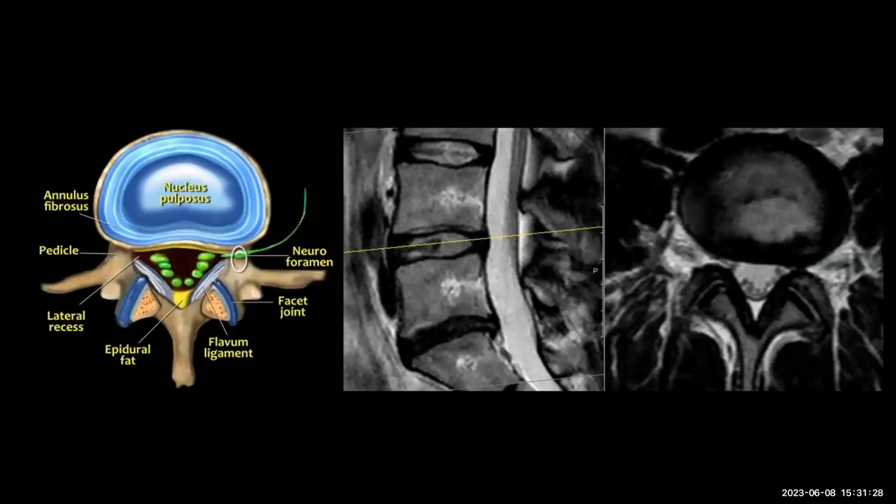So that's all about disc herniations and how they result in stenosis and nerve compressions. And as you've realized from the talk, it is not just quantifying the degree of stenosis of the spinal canal, the lateral recess and foramina, but you have to make statements about what impact they're having on the nerves themselves. What are the other causes that can result in stenosis or nerve compressions?